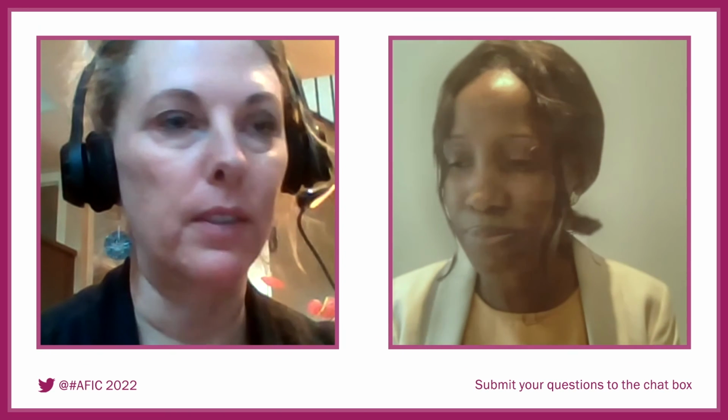Yeah, if you have monochorionic twins who are growing well, you're not doing the umbilical artery Doppler. You're not doing the middle cerebral artery Doppler PI, looking for brain sparing, et cetera, if they're growing well and they're concordant.